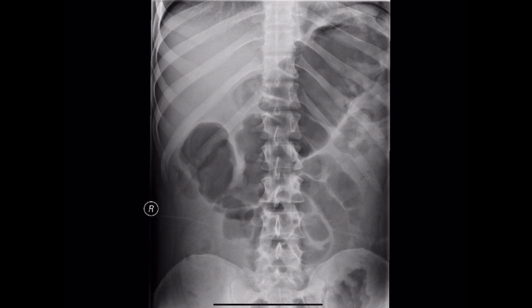So abdominal X-rays are useful for certain indications, and the situation you describe in a person with known colitis is actually quite a good reason to do an abdominal X-ray, because one of your questions will be, if that patient is unwell, do they have bad inflammation? Yeah. So what we're seeing with this, we haven't quite included the full pelvis on this particular image. Okay. But what we can see, what's really obvious, is the colon here.